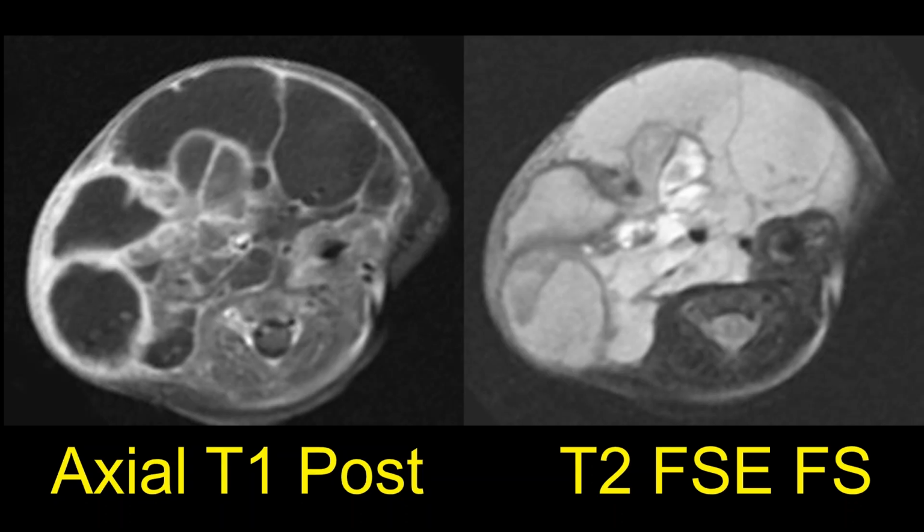Now, sometimes we can think about it kind of being an emergency for the imager or the radiologist. Sometimes we pull up a case and it just looks crazy. There's all these things everywhere. And one of the things that we talk about with cervical soft tissues, this is a pediatric case. You see the spine looks very small compared to the rest of the neck here.